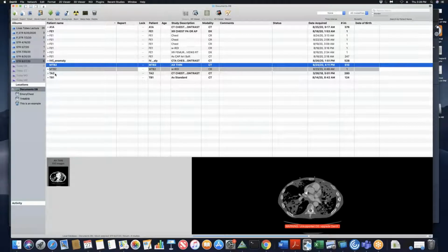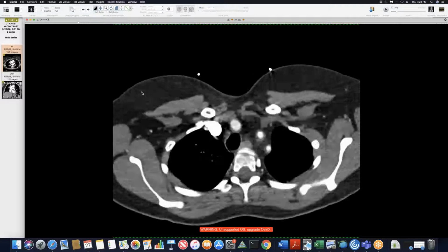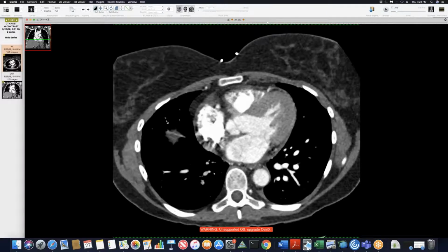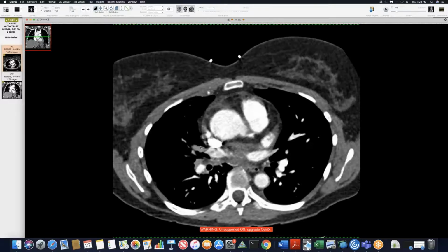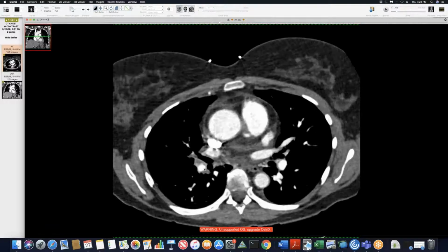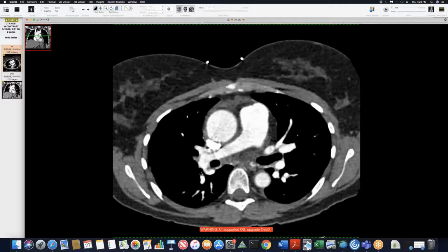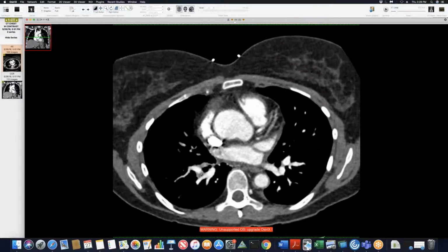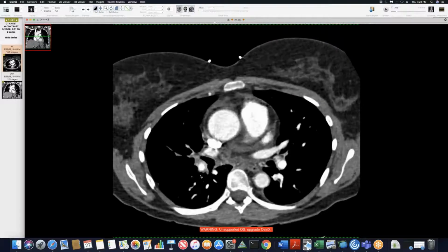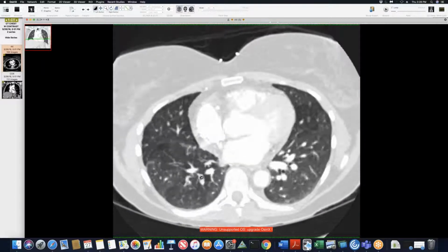This one is a nice one. We'll go down here first and show this one can serve as a mimic to some other diagnoses. If you follow this pulmonary artery here, you all of a sudden lose it right there. Put on lung windows, you can see mosaicism.